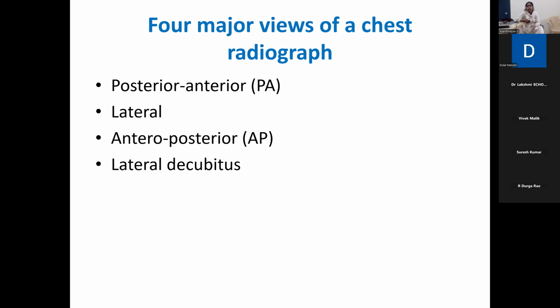So we know there are four major views such as chest radiograph. Mostly we use the first three, but sometimes the fourth one is also used. I'll tell you where you can use it. And beside these four views, there are so many other views.